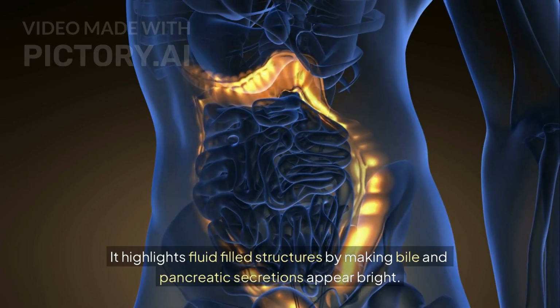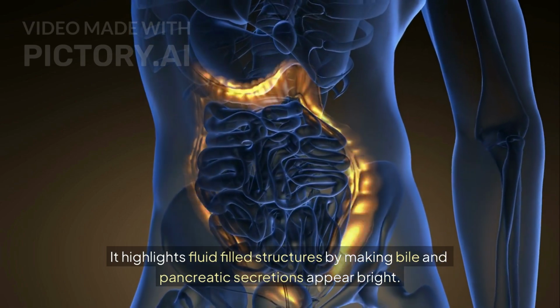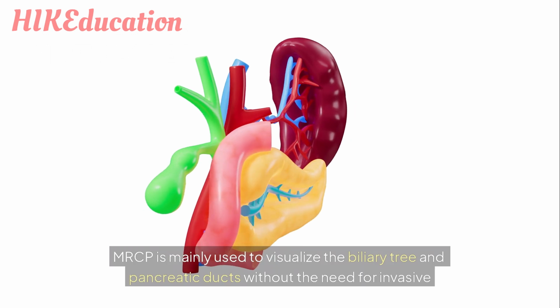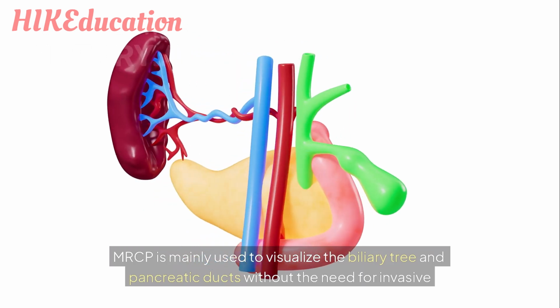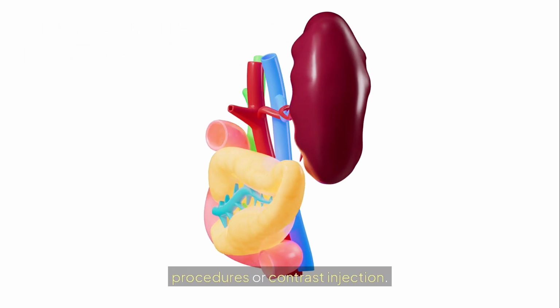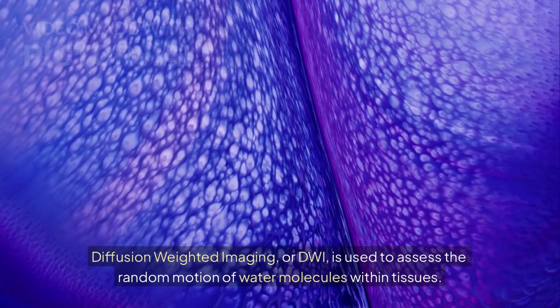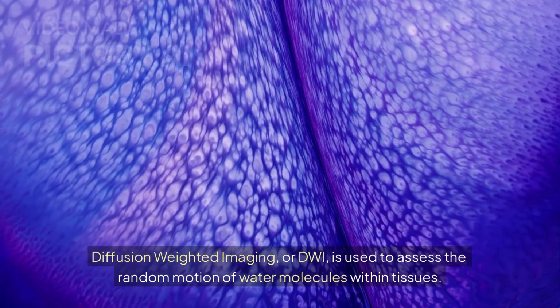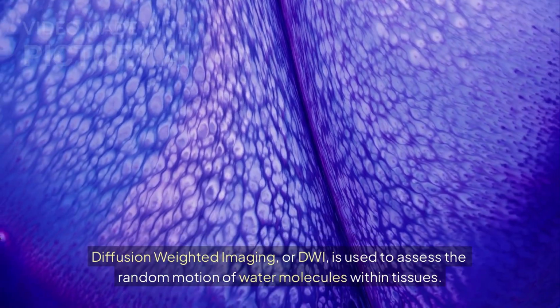MRCP, or magnetic resonance cholangiopancreatography, is a heavily T2 weighted sequence. It highlights fluid-filled structures by making bile and pancreatic secretions appear bright. MRCP is mainly used to visualize the biliary tree and pancreatic ducts without the need for invasive procedures or contrast injection.